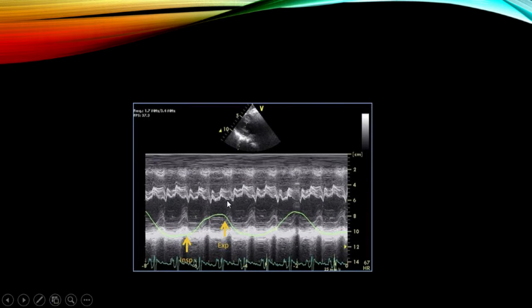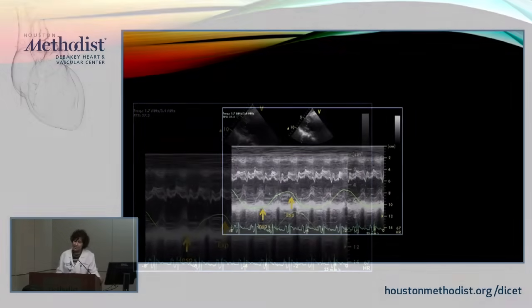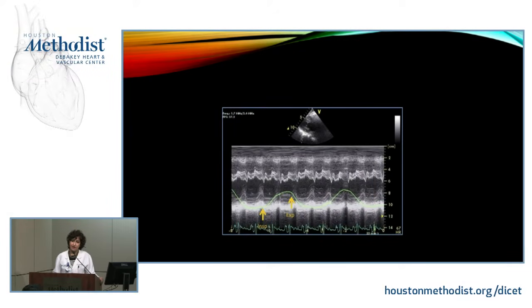And the septal shudder, or septal diastolic bounce, is seen beat to beat. So it is not just related to inspiration and expiration, but you're seeing it with every beat. And this is due to the timing of the RV filling and LV filling being different, and the mitral and tricuspid opening time. So you see what is called a septal shudder. It is pathognomonic of ventricular interdependence.